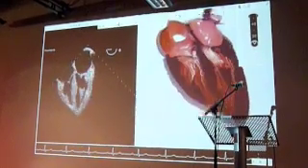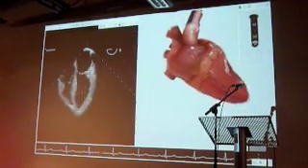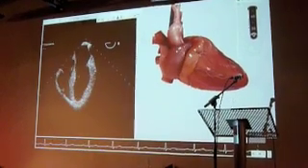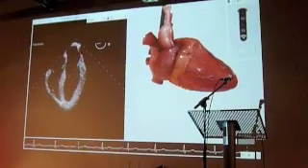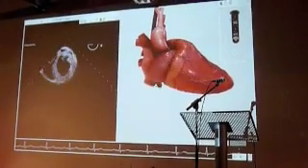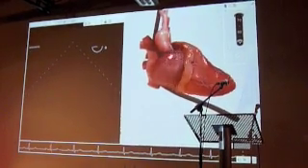The other thing which of course it allows us to see, which is often quite hard for students to get their heads around, we've actually been to a lot of the medical trade shows, primarily in the US, and it's amazing the number of experts who look at this and say, we had no idea that that's what the probe was actually doing when we put it in this position. Because when you push the probe right down into the stomach, and all they have to look at is this 2D ultrasound image, they don't see anything else typically.